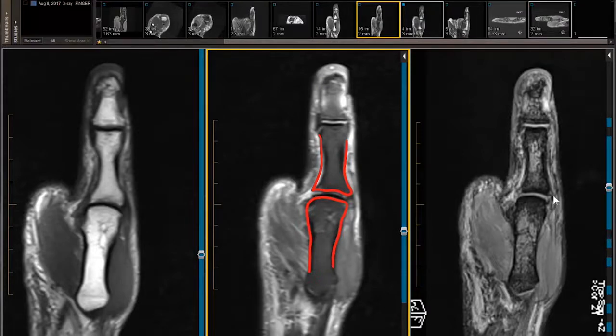And that's okay in people that use their thumb a lot or older individuals, as long as it's a continuous curvilinear structure. I'm sure you've already noticed that the contiguous curvilinear structure is disrupted on the ulnar side. But in the normal state, we want to see something that looks a bit like this, with about 2 millimeters of coverage on either side of the joint.